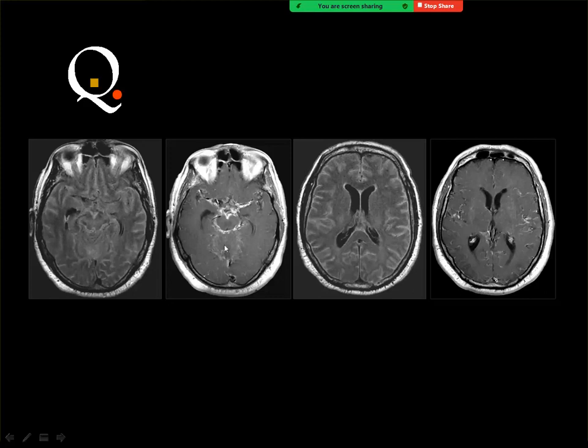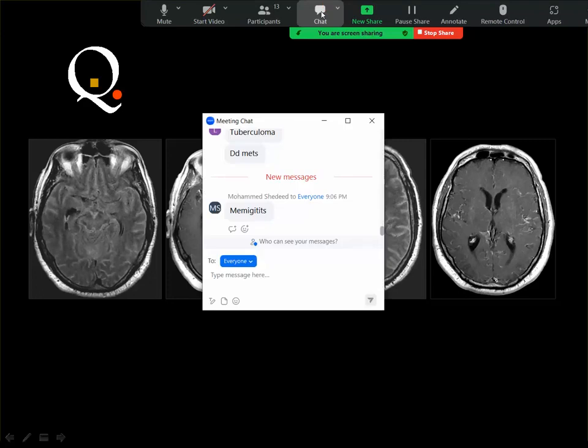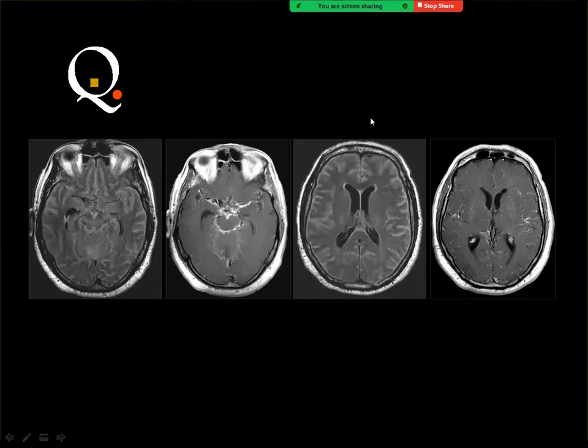This is FLAIR and T1, and this is FLAIR and T1 with contrast. Yes, the answer is right.